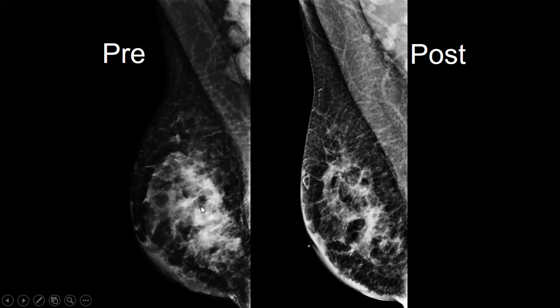You see that this is a case of inflammatory breast cancer, dramatic skin thickening. There is diffuse global asymmetry, trabecular thickening, and of course, axillary adenopathy here. But after neoadjuvant therapy in the post image on the right-hand side, you see that there is improvement in the skin thickening, as well as improvement in axillary adenopathy. Now, there is still a palpable lump as shown here, but that lump can represent fibrosis and scarring after the response to therapy and not only tumor. And overall within the mass, that global asymmetry has improved.